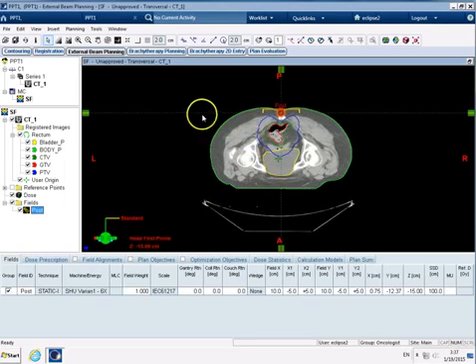And so you might know this being described as an applied dose. So we've got the SSD at 100, and the dose is prescribed to the Dmax point of the beam. Okay, so we'll have a think about that in a little bit more detail in a moment.